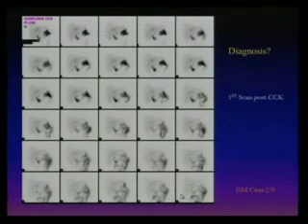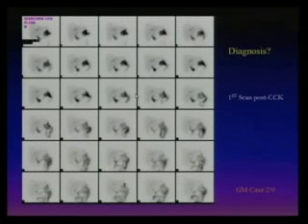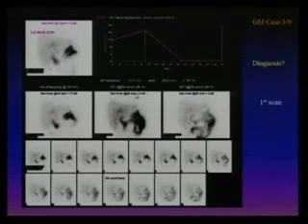Very good. And of course, the technologist did not show me. So they thought that this was the gallbladder when it was actually the duodenum. That gives you a lateral view, very important, I'll show you. So they gave us CCK automatically, and then they finished the study, turned it in, and they got 97%, a completely normal study.